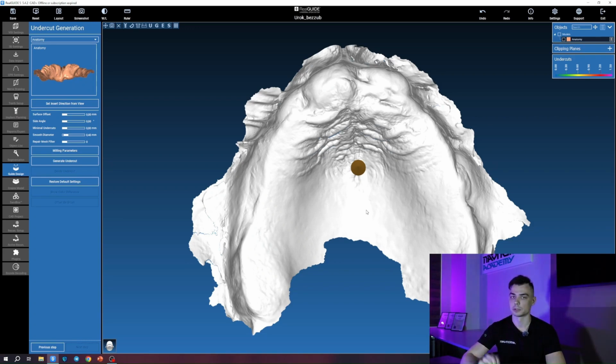That's why this thing serves 2 functions. First, it aligns and creates special radiopaque markers on the edentulous jaw. And second, it acts as a prototype for the future surgical guide. In other words, we double-check the fit of the future surgical guide.